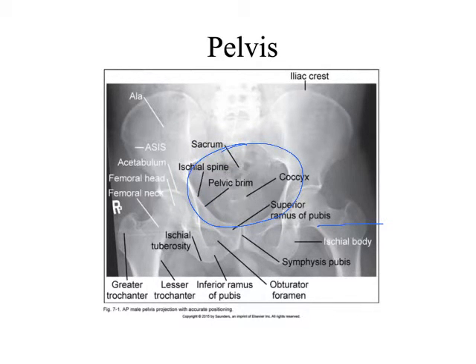But one of the things that we can do is revise our framing, right? We can revise the way that we framed the image, okay? Since we have such a large area that we've had to center on, it's difficult to say what exactly I'm centered on. Like maybe I'm just centered on this right here, right? But if I redo how I'm thinking about my framing, right?